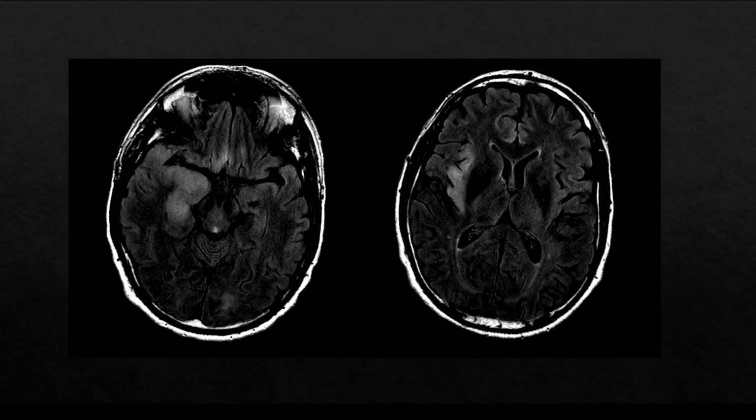Our last case, I want to touch on a different type of disease, but also a form of encephalitis. Here we have abnormal FLAIR signal and mass effect within the mesial right temporal lobe, the right insula, and the right cingulate gyrus, without much going on the left. So this is unilateral, but this process can be bilateral, and often is. This entity can restrict diffusion, it can cause gyriform enhancement later, and this is limbic encephalitis.